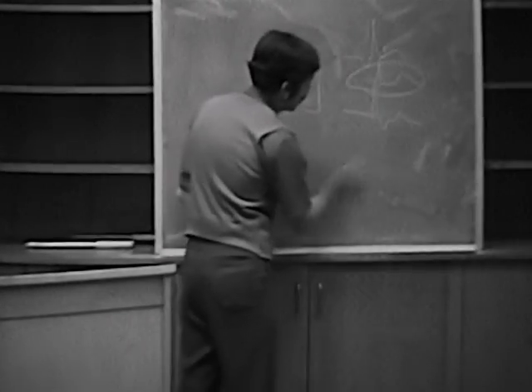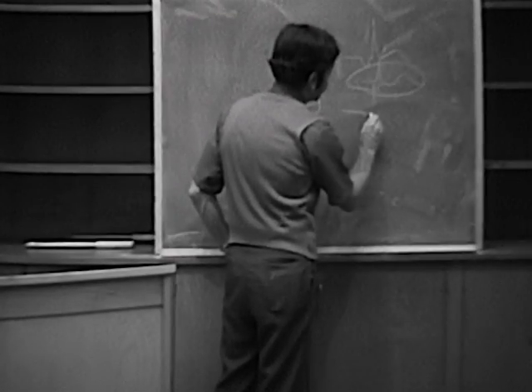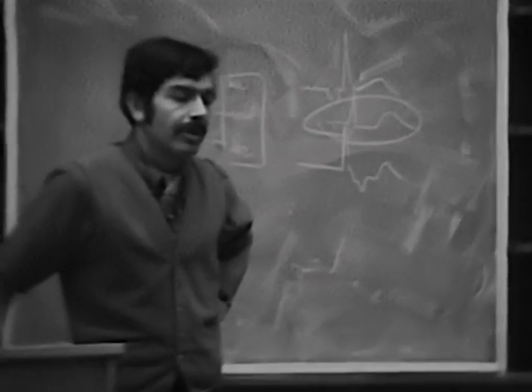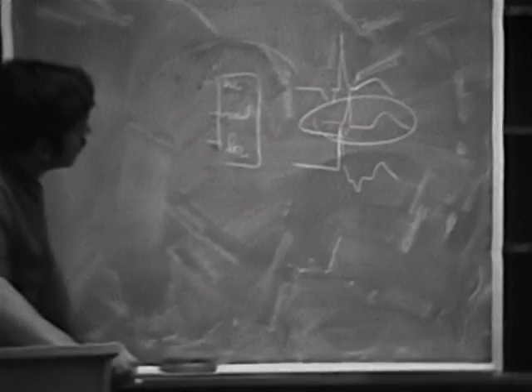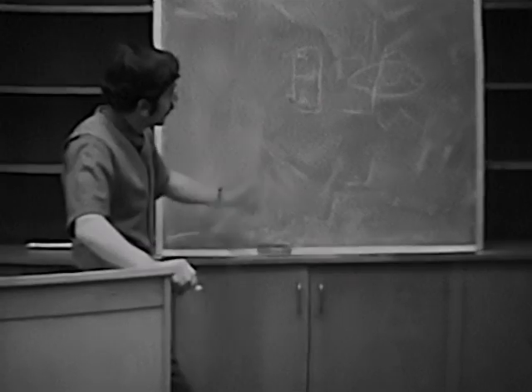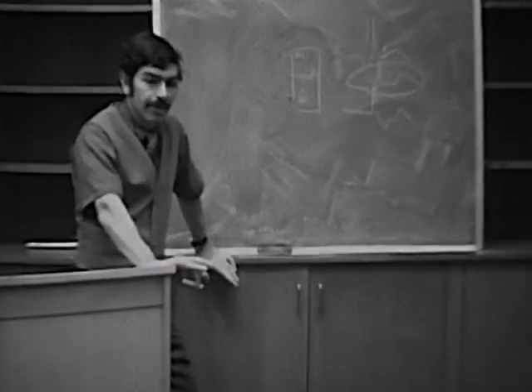Okay. So nodal beats can have these configurations on the electrocardiogram. They can have no P wave, they can have a P wave preceding or a P wave following the QRS, right? And the QRS looks identical to normal. It usually looks perfectly normal, okay? And then you can have nodal premature beats. You can have nodal escape beats.